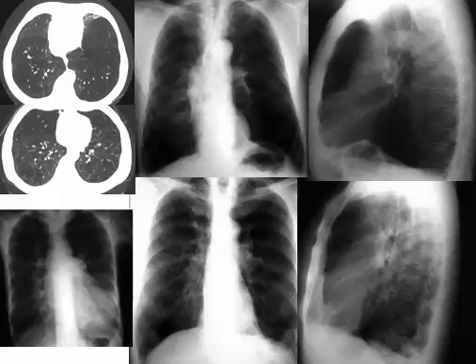And to diagnose emphysema on chest X-ray, we have barrel-shaped chest, we have transversely oriented ribs, we have lower level of the diaphragm, and if you trace the vessels going outward, you will hardly be able to see any in case of emphysema, while normally you can trace them in the medial third, to the middle third, and hardly in the outer third.